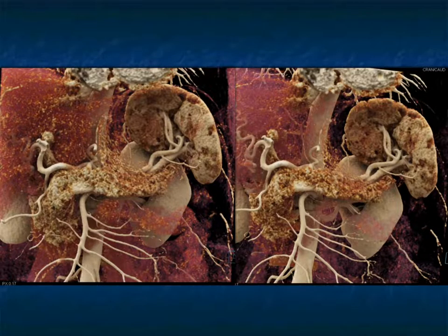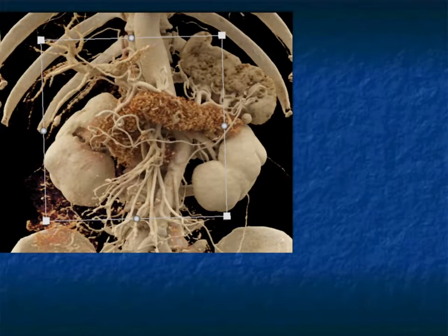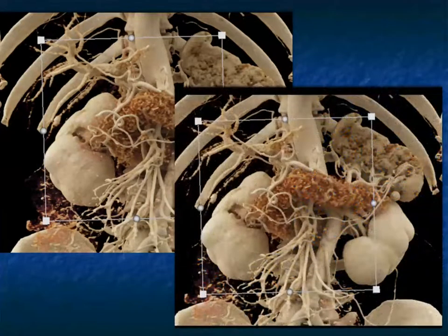Again, the textural changes of the pancreas are important because it's our experience to pick up small pancreatic cancers or small neuroendocrine tumors. Changing the texture and optimizing texture mapping may be an ideal way of seeing small tumors. Here's a good look of the texture of the gland, the relationship to the patient's vessels, whether it's GDA, hepatic artery, or SMA.